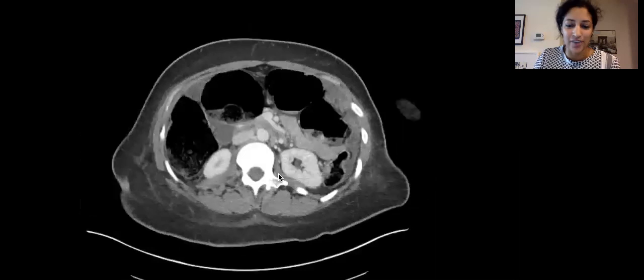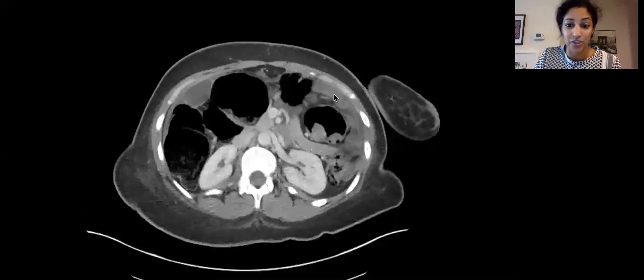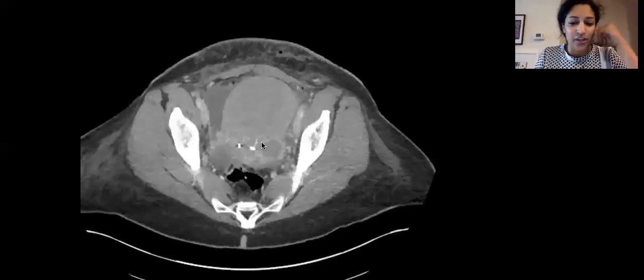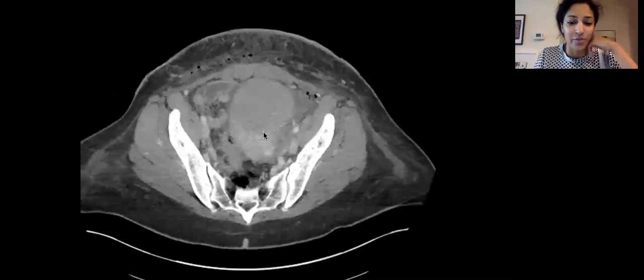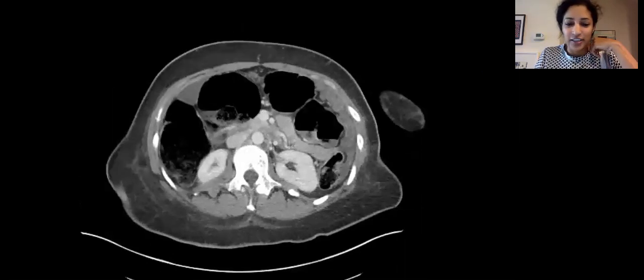And they ended up having to abort the hysterectomy because they found what we can see here, which was peritoneal carcinomatosis, just incidentally found. And so the question came up, was this due to maybe a leiomyosarcoma that was miscalled a fibroid? But looking back on our MRI, they looked just like fibroids. But my fellow made a great call, which is that he looked on the lung windows.